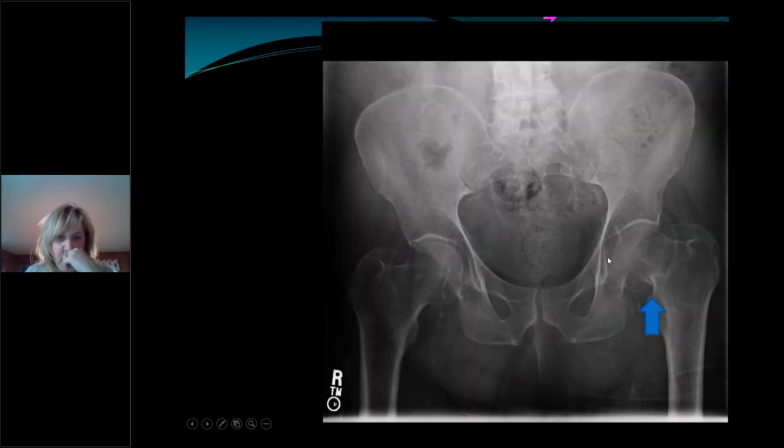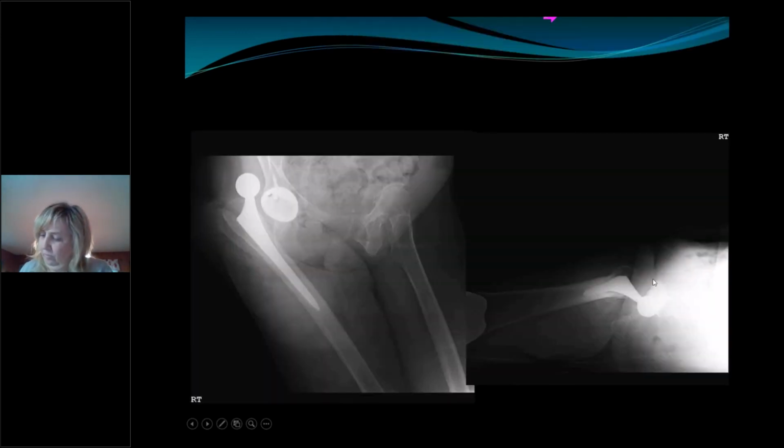Here's another fracture, the inferior pubic rami, or excuse me, there's another fracture of the femoral neck, impacted femoral neck fracture. Unfortunately, just like fingers and toes and other things and shoulders, you can dislocate. When you have a prosthesis dislocated, it's a very hard reduction. So most of these go to the operating room. Although some guys will say, oh, try to put it back in. I can tell you it's almost impossible without knocking them out with conscious sedation or even full sedation, because it's just so hard to get that thing to reduce. But nonetheless, just like real parts, fake parts can dislocate as well.